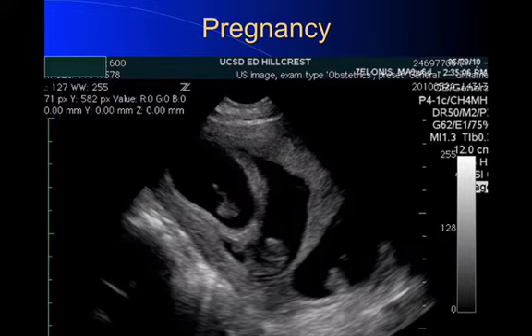Now we're going to talk about pregnancy, and most pregnancies are not triplets like this one, but we will go on to talk about certain things that you should look for.